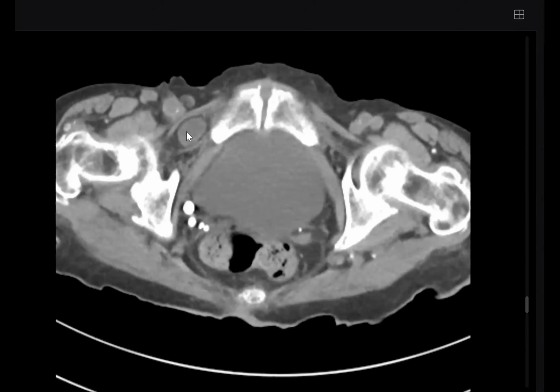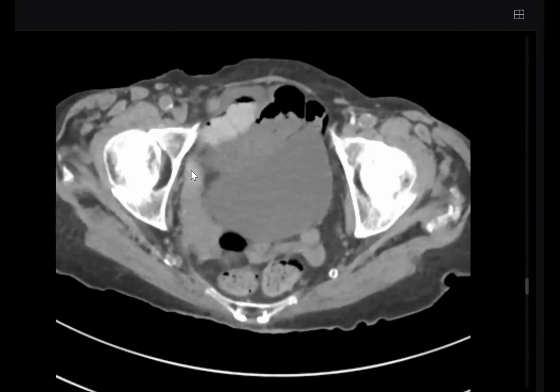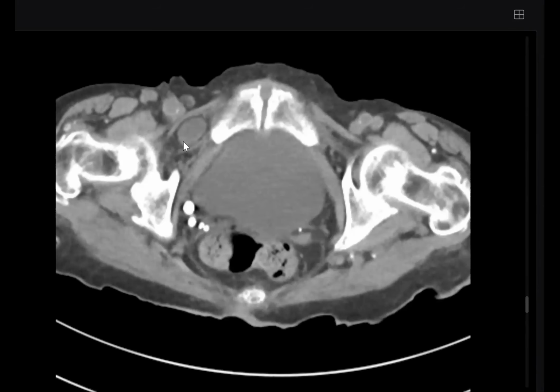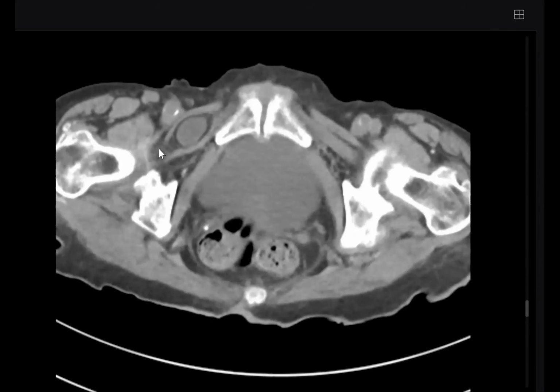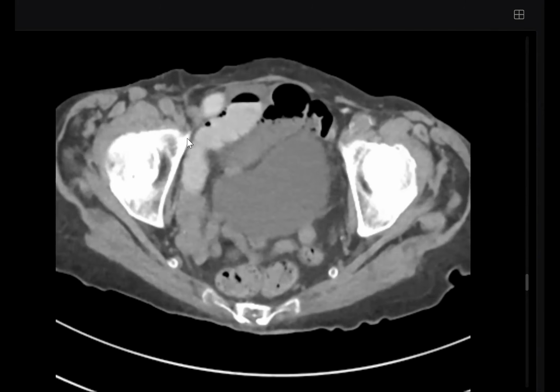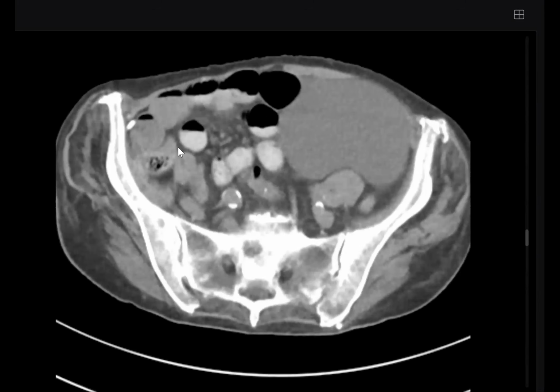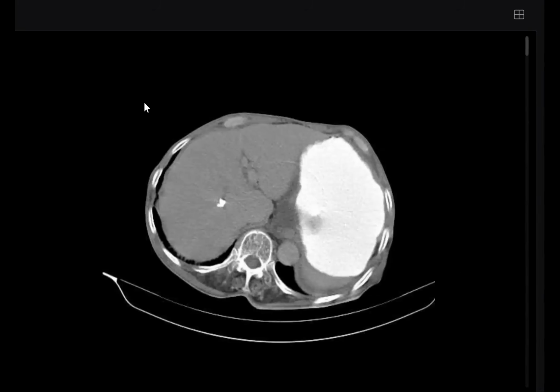Okay, you see this bowel loop, up, up, up, oh, here. So this is a transition point. And again, no significant mural thickening, clear surrounding fat plane, so it's obstructed, but unlikely strangulated. And again, in my routine practice, I will check the lung window and I check the vessels and, in a contrast study, of course. Okay, so this is obstructed obturator hernia. What about the next one?